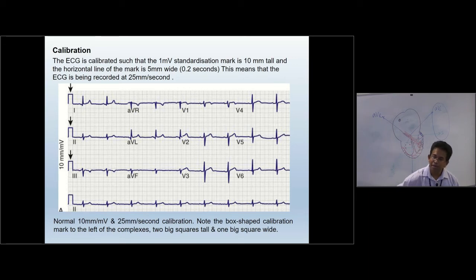Calibration is important because some patients don't produce good ECG waves. On the paper you will see very rudimentary ECG complexes. Their voltage is so low that you can't pick up any pathologies. Say, for example, your patient is obese, or a chronic smoker with COPD or asthma, or has a pericardial effusion or something. They don't receive much electricity onto the surface. Because of that, the ECG graph will be very poor with small complexes. Then for the interpretation, you need to create a bigger wave.